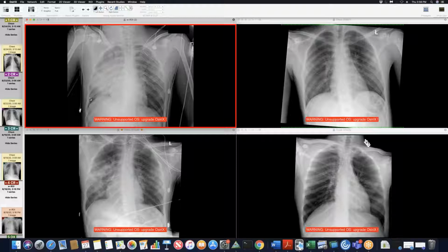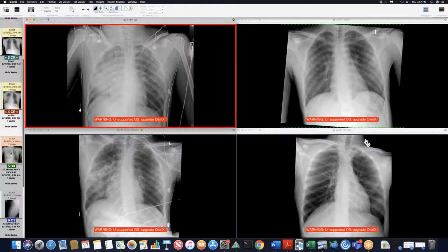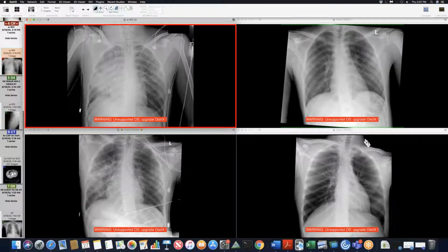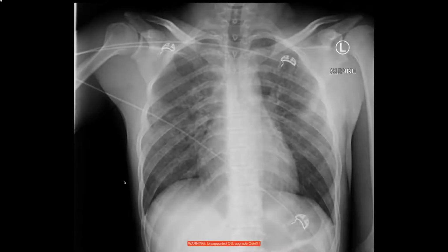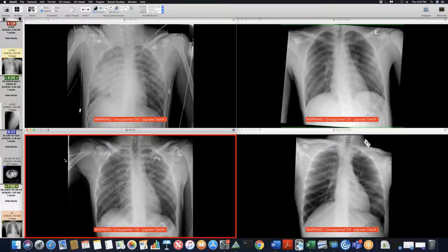Yeah, for sure. But the timeline doesn't really fit, right? Because fat emboli shouldn't be on the first image because they have more of a delayed presentation. Right? You're saying this is their initial presentation, right? Initial presentation was this. This one here was the initial one. So he had some. Okay, so he has some, yeah.